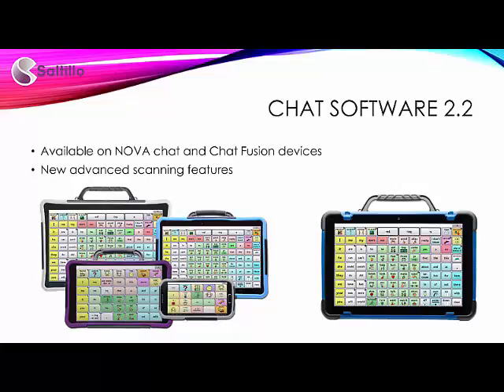If a client is unable to use the touchscreen accurately or reliably, or if it causes a great deal of fatigue to do so, switch scanning may be an appropriate access method for them. Chat software version 2.2 added many new features that allow us to fine-tune the scanning experience for the individual, including the ability to adapt the patterns, the timing, and visual effects to assist with scanning. Finding the right fit through these features can make all the difference for the client.